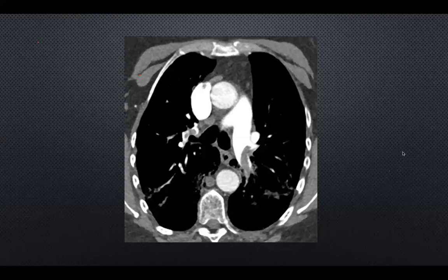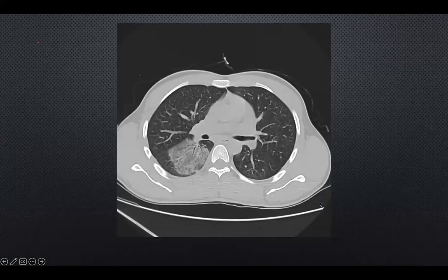There are hundreds of slices in a CT, but if you can see my scroller, there's contrast within this vessel, the pulmonary trunk, and the contrast is all there, but you've suddenly got black bits here. So this is a large pulmonary embolus. But like I said, I think these CT chests are quite specialized for your level.